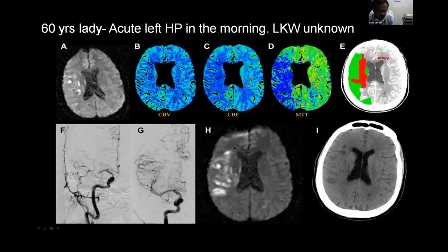I'm not going into the technical detail of how CT perfusion is done. I can only say we can use 50 ml of contrast only. You can do it a few minutes after CT angio also, or straight away in a suspected case, or doubtful stroke timing or wake up stroke, you can straight away go for CTP also. But CTP can also be reconstructed to have a vascular anatomy also.